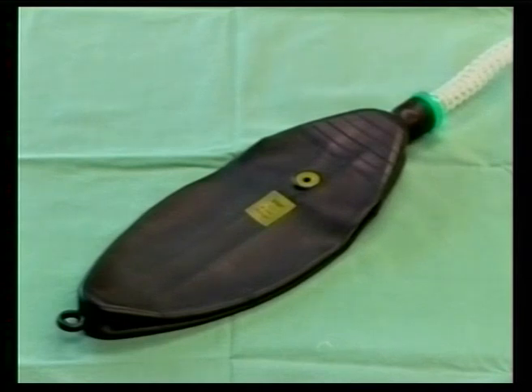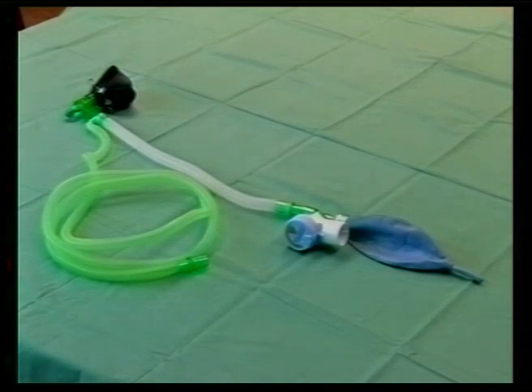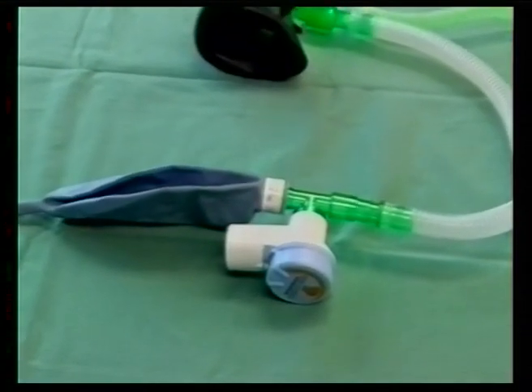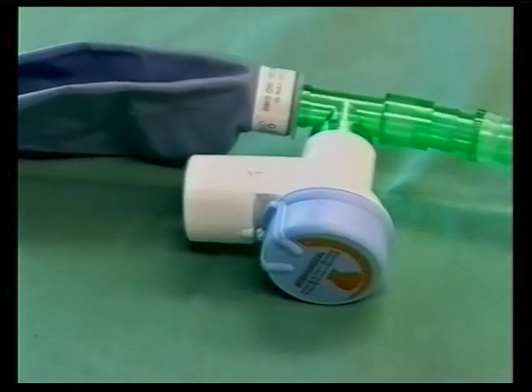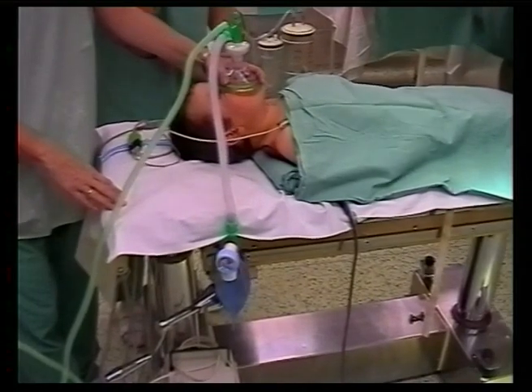Another open-ended bag is the Kuhn system. There exists also the possibility of using a valve which obturates the expiratory part, as opposed to the manual way by the Jackson-Rees system. Theoretically, it's a different type according to the established classification, but the use is basically the same.